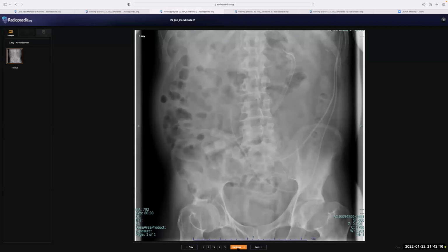So this is an abdominal radiograph of a 40-year-old male patient who has presented with sepsis. I can see a tube going up to the left hypochondriac region. This could represent a gastrostomy tube. I can also see two further tubings coming across and ending within the abdomen. I'll make sure this is not outside the patient's body. I'm wondering about the nature of this tube. Usually in the abdomen, we see part of VP shunts or peritoneal dialysis catheters. There could be drainage catheters after surgery. I will correlate with the clinician regarding the nature of these tubes.